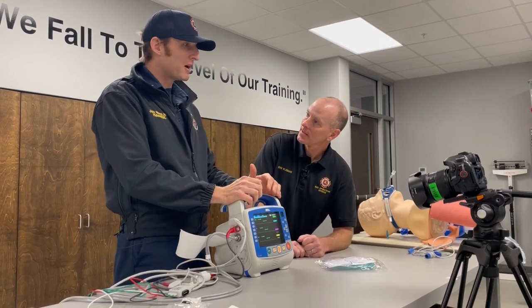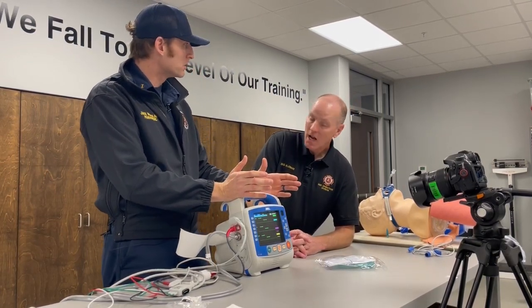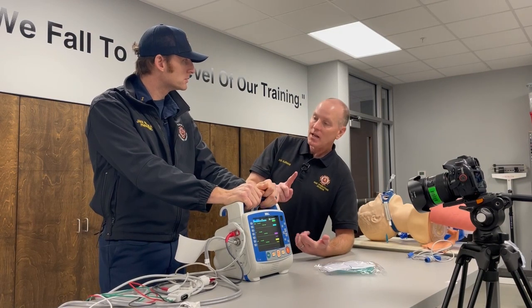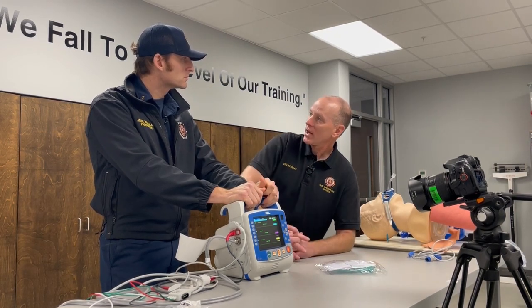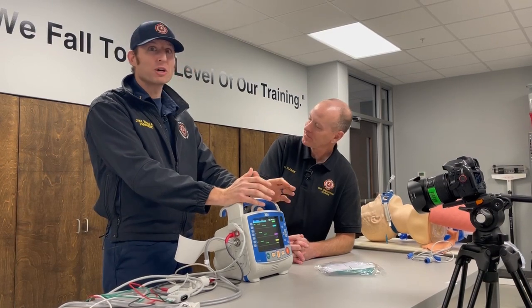So now we talked about what we're looking at. Let's talk about application. What type of patient will we use this for? I use it on every respiratory patient. Yep. This, the pulse ox, to me is the secondary. This is the primary because I can actually see, are you ventilating appropriately, and are we getting oxygen through that ventilation, and are you utilizing it on the cellular level? Yeah, so you actually see respiratory effort. Correct. Something a pulse ox will not give you.